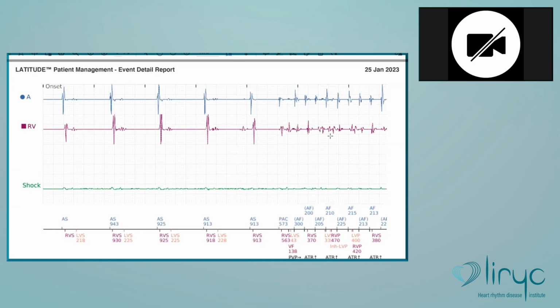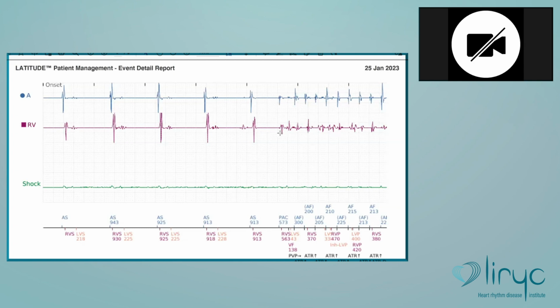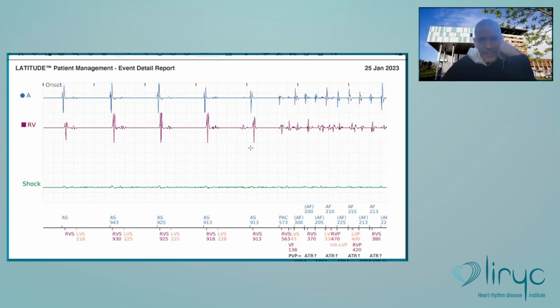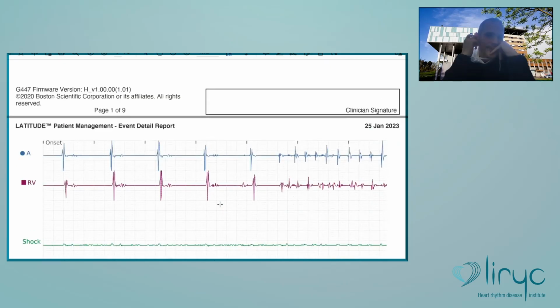Here, say there's a problem with the lead. When there is a problem of the lead, you see here the patient is spontaneous. So these are supposed to be the right ventricle signals. Now, if you say there is oversensing, you should still see the real ventricle signals. If it is oversensing of something, I would expect to see, at exactly the same timing, the real ventricular signals, and that's not the case here.